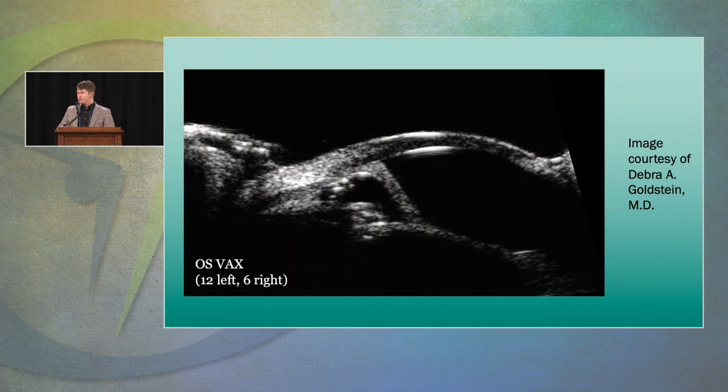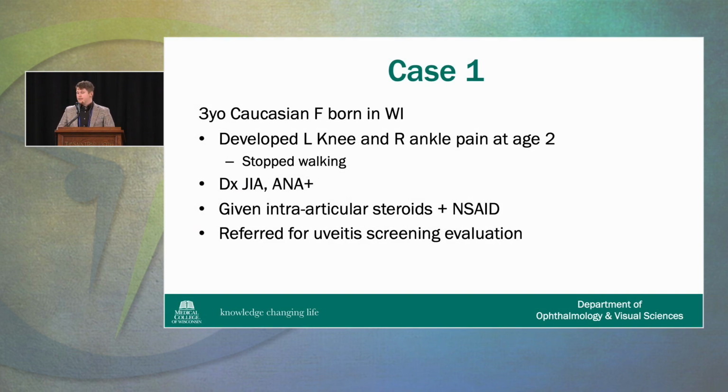And then if we go forward, this UBM shows you that vaulting of the iris, and it will actually reveal that that's a pseudophakic lens that's synechiaed down there. So we're headed towards cocooning that lens, and this eye is not doing well. So let's start talking about the bread and butter first, but I just want you to see those to be scared.